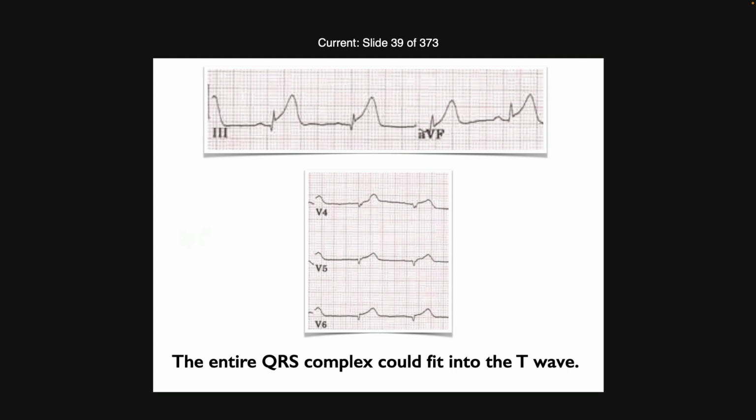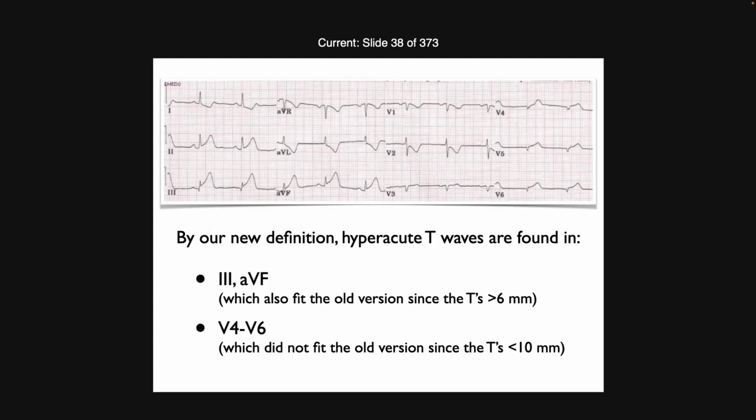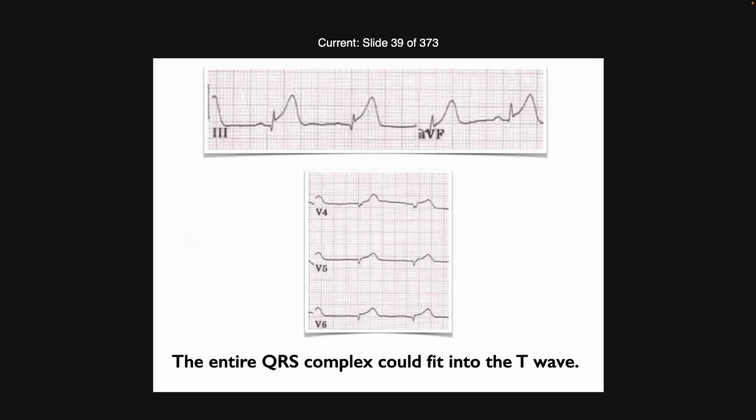The other thing, by now, I'm hoping that you're starting to recognize this pattern, the really common one, okay? Inferior STEMI with lateral involvement and possible posterior, okay? And that's almost certainly because of an occlusion in the right coronary artery, and it's a pretty common pattern, okay? So questions, everybody understand what you're looking for here?